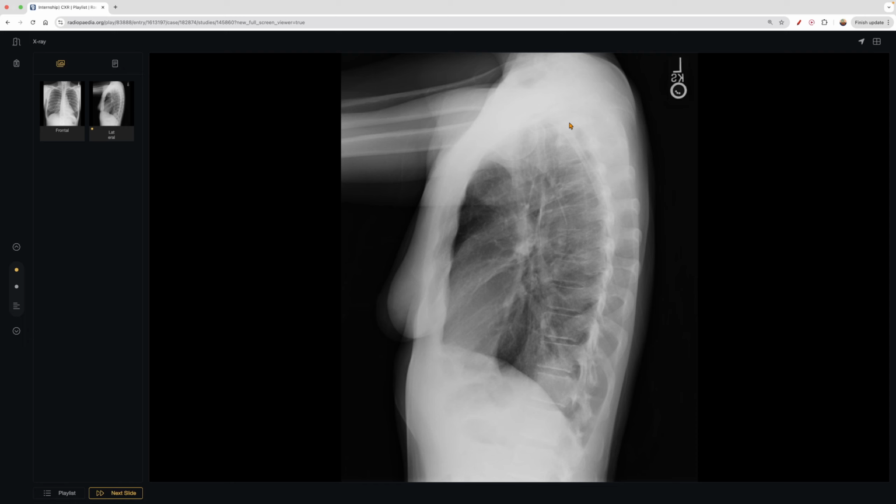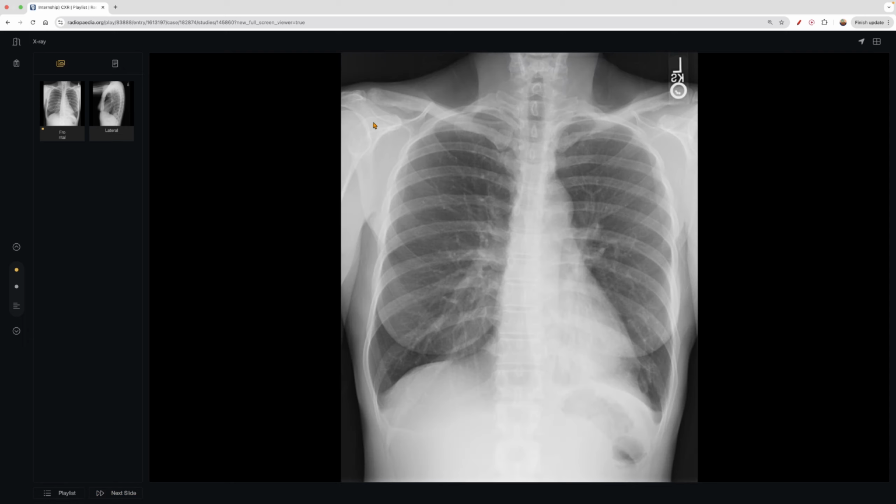And so let's take that concept and apply it forward. So we have this patient here. Let's look at the frontal. So chest radiographs go across the clavicles, no fractures, coming down. Okay, so the left costophrenic angle is a little suspect. And then we go back up, nothing here, go back down.